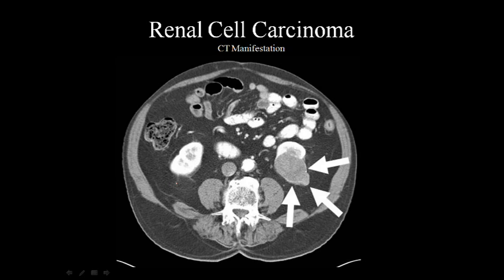This patient has a good right kidney, and then we have this on the left kidney. So we see that we have what looks to be a weird border, because we see that it's kind of lobulated, goes out like this. So that's one of our first signs that it's not just a nice smooth round cyst.